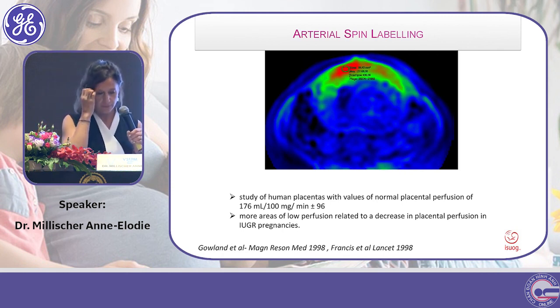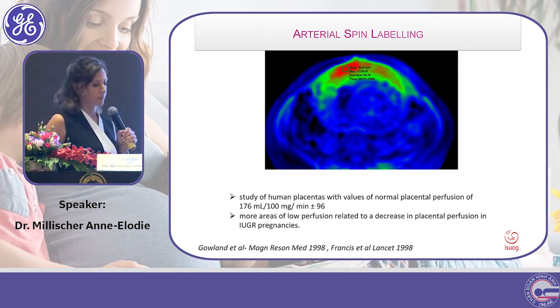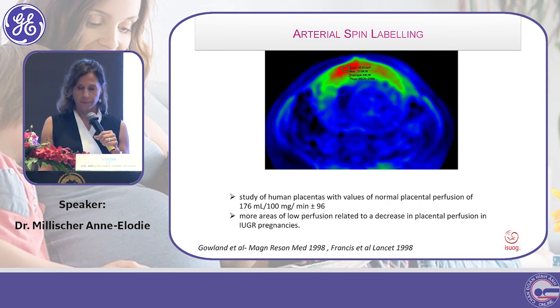And with this kind of techniques, we'll be capable to measure the perfusion of the placenta without adding any contrast. Và cho cô nói thêm một vài trước khi kết thúc là cô muốn giới thiệu đến các bạn là đó là một loại hình ảnh học chức năng của bánh nhau. Thì cái hình ảnh học này nó sẽ cho biết cái tuần hoàn nhau thai nó có bị suy hay không. Và đây là một cái hình ảnh mà tưới máu bánh nhau.